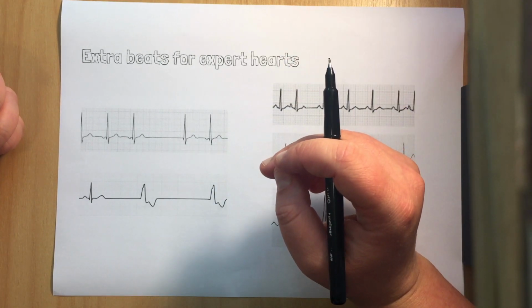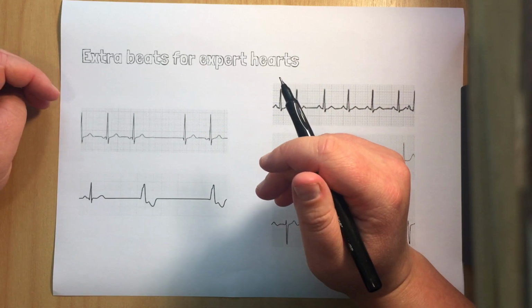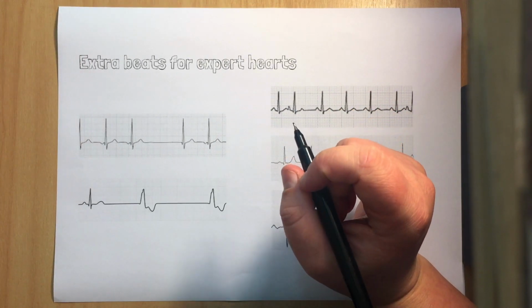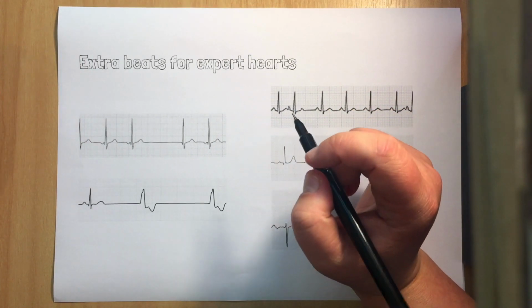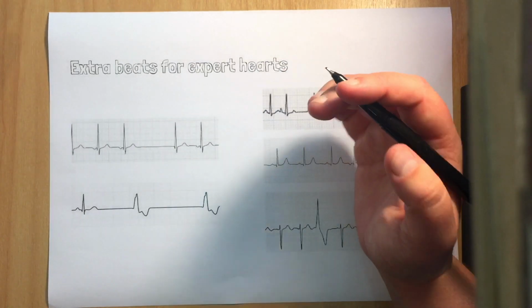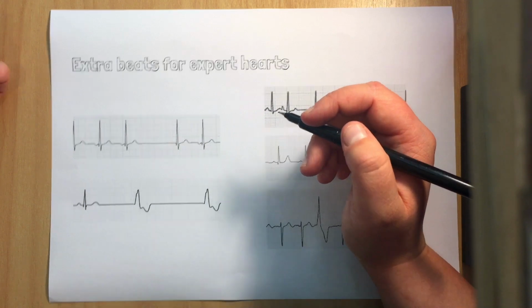So it's allowing the AV node or the ventricle to get a word in edgeways, basically, because the sinus is shut up. And so what happens there is that you have a pause and then a beat, and then potentially you resume sinus activity, just depending on what's going on.